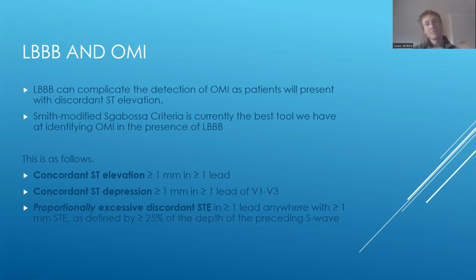So I think if you read that and you have no context as to what any of that means, or you don't have an ECG in front of you, that's really hard to get your head around. But I hope that if you revisit how we just broke down that previous ECG, this can start making sense to you. Okay, but I do appreciate it's really confusing. Okay, moving on.